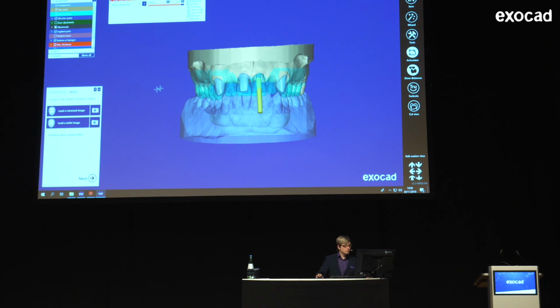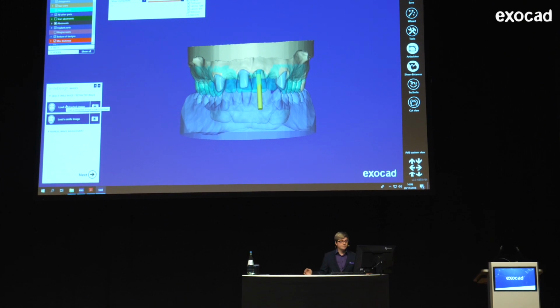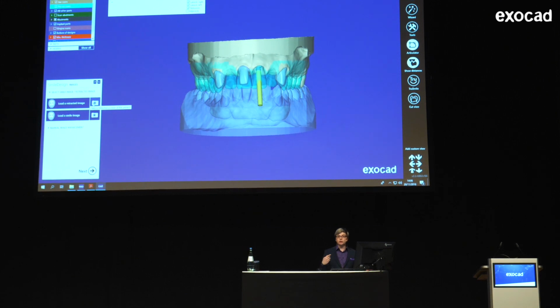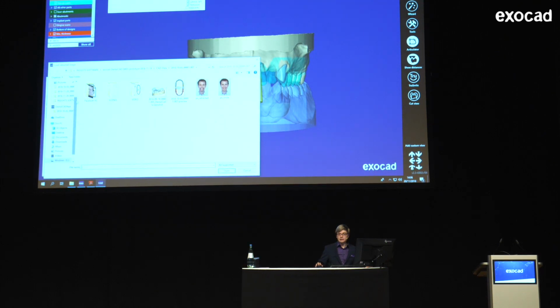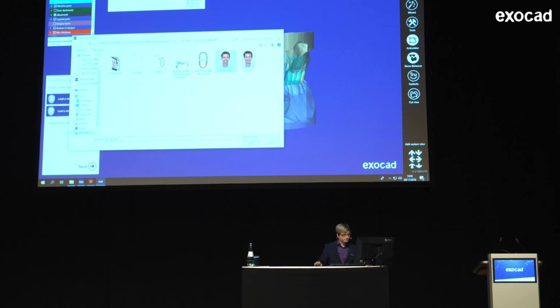The first thing to do would be loading a retracted image. This button here just gives me the option to load an image from my computer. The button next to it actually activates the webcam, and I could take a picture right now. But I always scare myself when I try that, so I'm not going to do that now. As well as I'm not the patient, so I'm just using a retracted image from our patient.